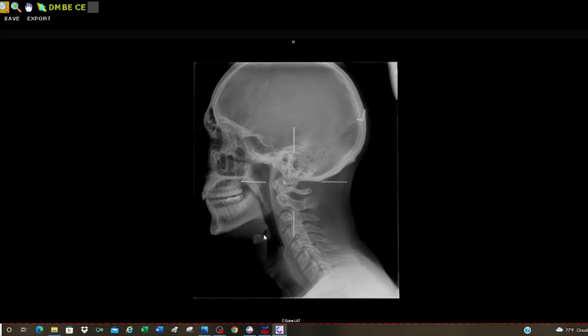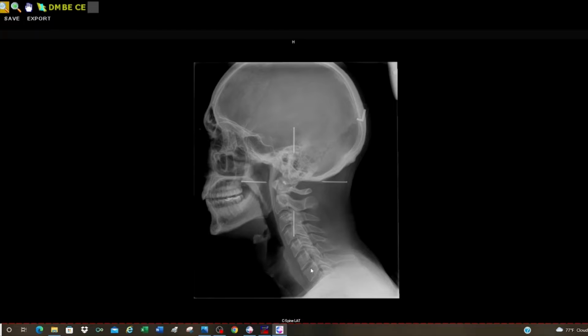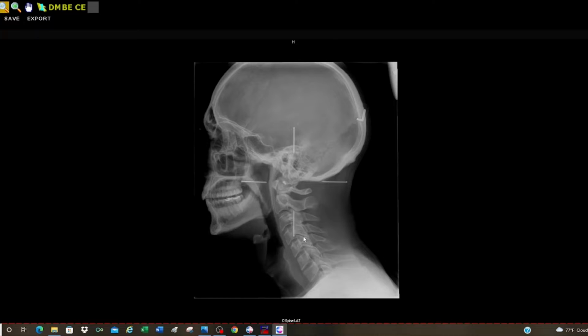This is the hyoid, the floating bone. We can see where the tube, which goes down into your mouth and lungs. We won't talk about any of that. But what we are going to mention is some clamping that we see on the back side of these vertebrae. These vertebrae are supposed to be nice and open like what we see here. If I zoom in, we can see a nice fat disc spacing in between the vertebrae. If we come in over here, though, we can see that clamping, that spacing is clamped down on this backside. So we are going to keep note of that as we move forward.